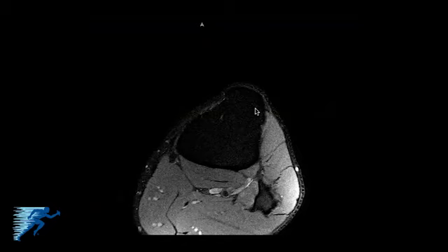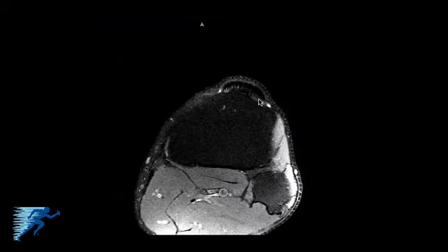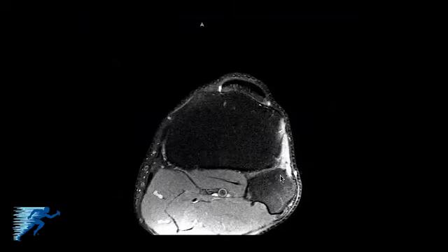And this is in the tibia, so the tibial tubercle is here. Here's the fibula, and you can see the neurovascular bundle along here. As we go more anterior, we'll start to get closer to the joint. You can see the patellar tendon start to separate away from its attachment side, and you can see the proximal tib-fib joint start to form here.